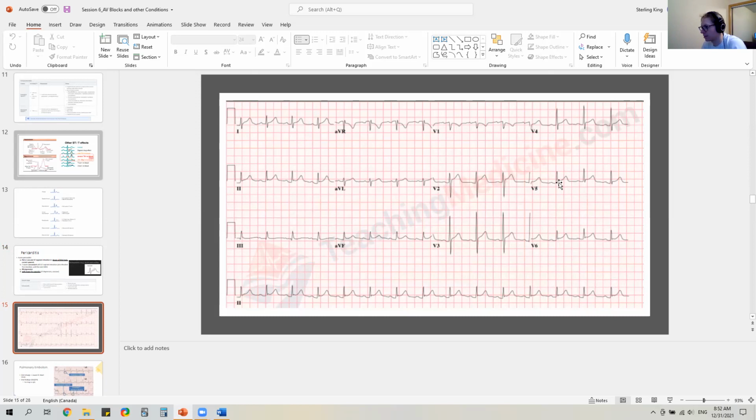Let's check over V5, V6. Yeah, same thing. Lead 2, lead 3, not so much. Lead aVF, yeah, it's still there, elevated, and with that kind of concave T. And then if we went through V1, 2, 3, 4, 5, 6, you can see almost all of them have the concave, and it's going up with an ST elevation. And aVR is reverse. So it's got ST depression with that concave shape. So if you see almost every single lead with a concave T and ST elevation, it's probably not just a massive heart attack. It's probably pericarditis.